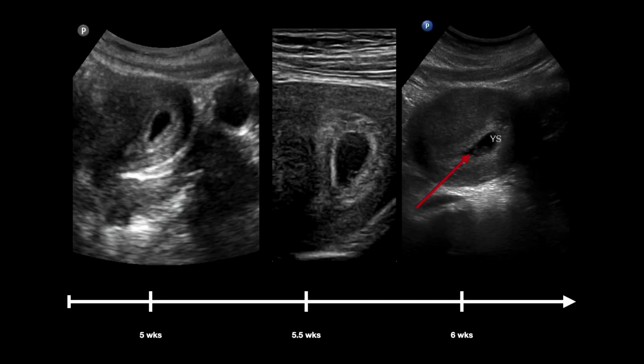And so if you see that, you can say, yeah, I'm generally about 5.5 weeks. And if you don't see anything else, then you can say I'm pretty decently sure you're in that age range, right? And then finally, the fetal pole begins to develop around 6 weeks, right? Again, in my experience, maybe I've seen a few earlier than that. Definitely you see them later than that. Around 6 weeks is kind of where they all start to cluster, as to when you start seeing the fetal pole, right? So 5.5, or 5.5, 6 weeks, the normal progression in early first trimester, is a really, really helpful metric to say approximately where you are in the pregnancy, right?